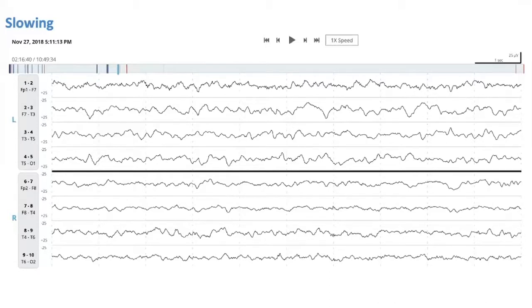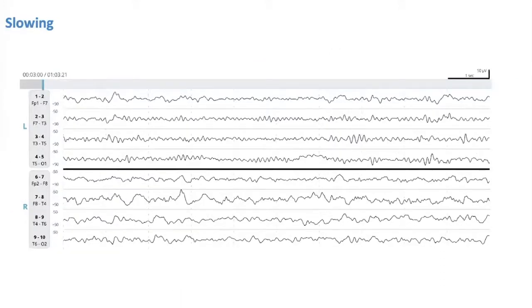Can't say exactly where it is precisely because it's EEG, not MRI. But the level of asymmetry is concerning. If we saw that in the next second, it was you will have better focal slowing here, Doctor. Yeah. Then it might be a shifting asymmetry, but the prior one showed an asymmetry to it. And so the slowing is not a sign of a seizure. So slowing is maybe a sign for a scan to understand why the slowing is present, but wouldn't warrant a change in treatment. Yeah, this pattern.